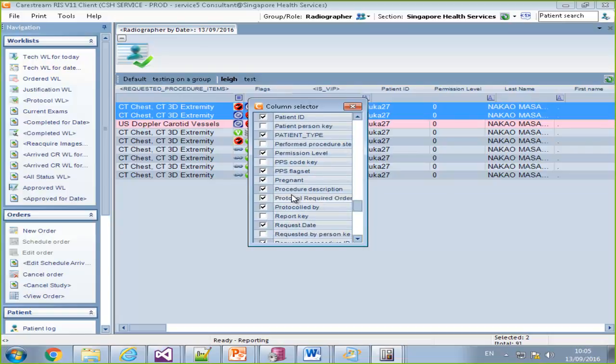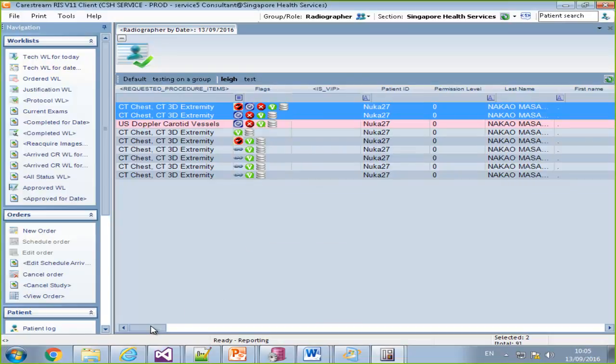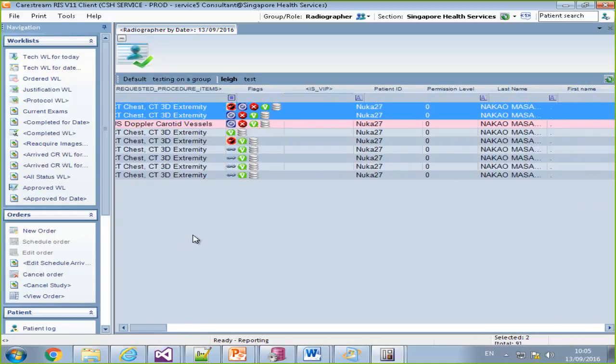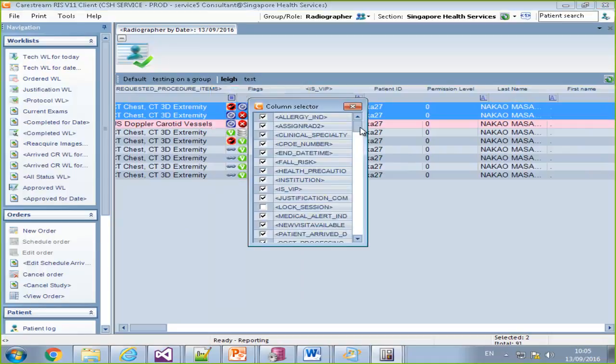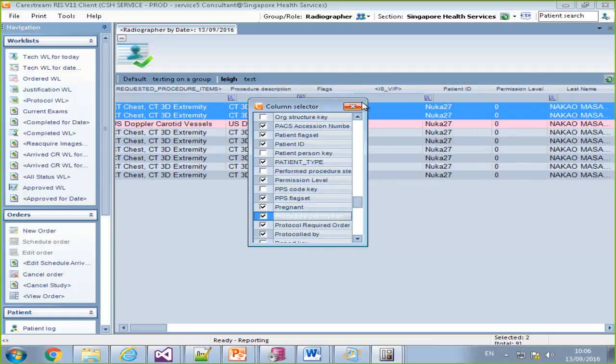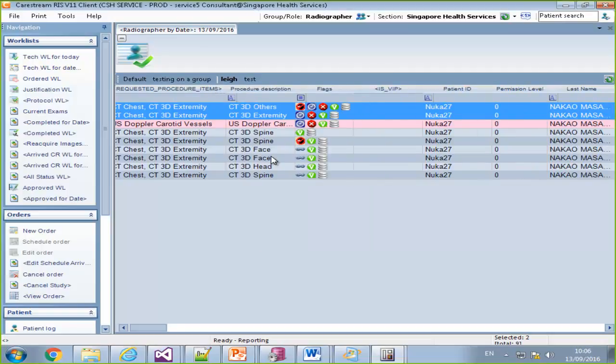You can grab it and drag it. Just drag it and stick it somewhere. It's requested procedure. You just drag it right from there. Yeah. Those are the untranslatables. It would be nice to ignore the brackets. Okay, so we see those. Okay, we see those new study.